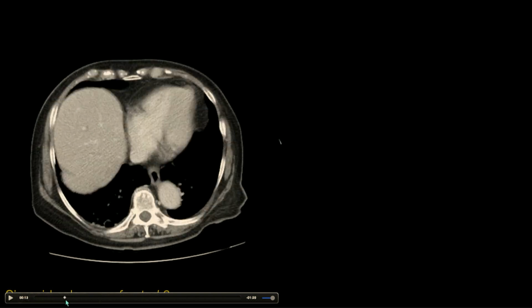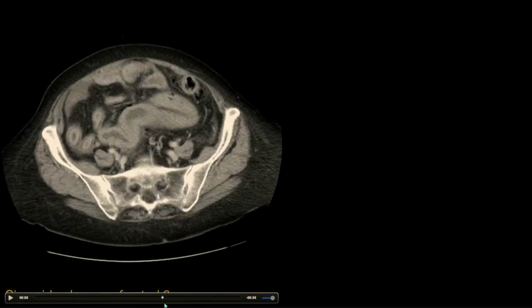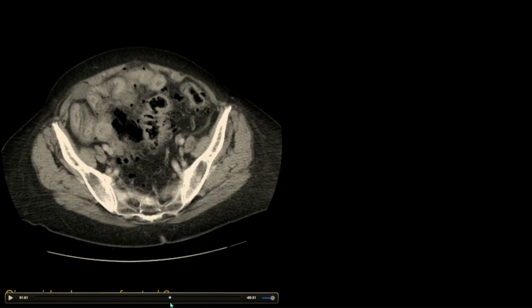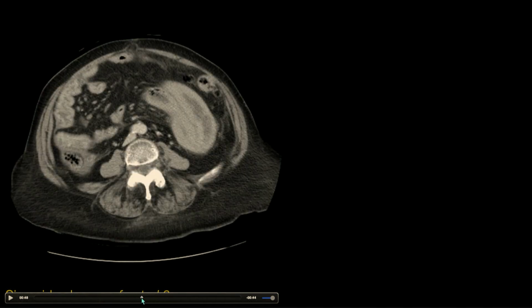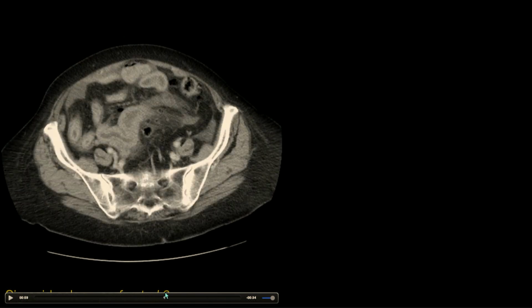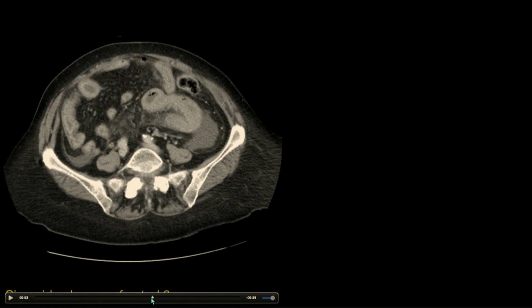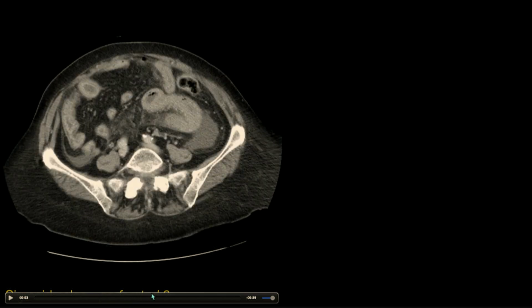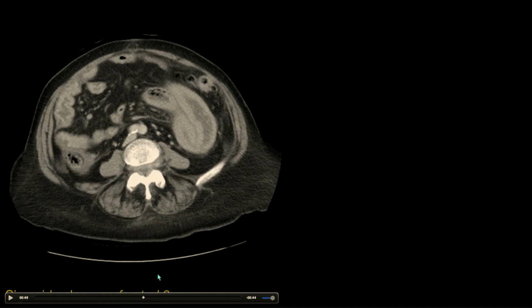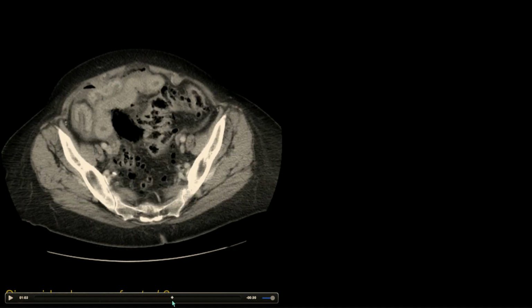Let's see what this one shows us. So this is a different pattern that I think is really helpful to have your eyes trained on. And this is a pattern of peritonitis. So look at how thickened that small bowel is. That's just so impressive. There's a huge long segment of super inflamed small bowel. And maybe when you first scroll through this, your first thought is, okay, this is like a severe enteritis. But notice how it's really much of what's inflamed is actually the outer wall or the serosa. So there's something contacting the small bowel that's causing such impressive inflammation.